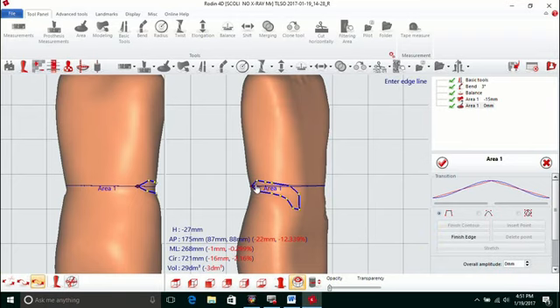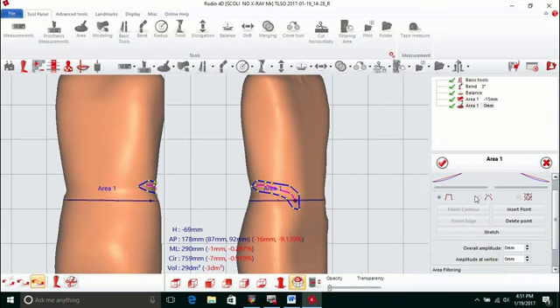Now I'm going to draw the inside, the action line. This is the line that's actually going to be doing the amplitude, negative or positive. So if I left click, left click, left click, action line. So once you get that drawn in there, now you tell the software Finish Edge. That tells it, okay, I'm done drawing my perimeter and my interior. Now we're ready to do the actual mod.